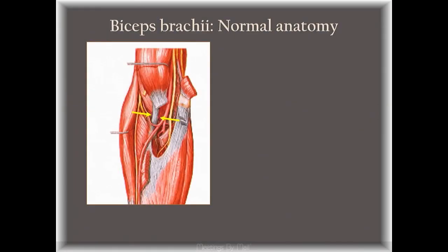Okay, so now that we know this, let's talk a little bit about the biceps tendon. The distal biceps tendon is a flat tendon, shown here between the arrows, that forms about 7 centimeters above the elbow joint. As the tendon courses distally, it moves obliquely from anterior to posterior and from medial to lateral. And it also twists 90 degrees such that its anterior surface faces laterally. Its attachment on the radial tuberosity, which you can't see here, is wide and includes distinct footprints for the short and long heads.